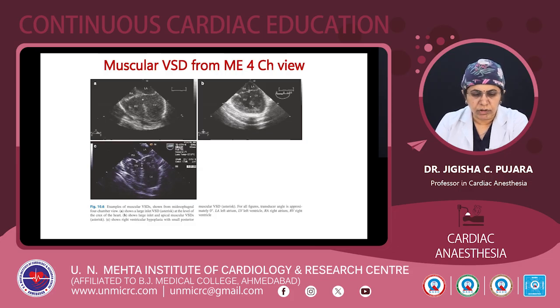And figure C shows right ventricular hypoplasia with a small posterior muscular VSD. Here again the asterisk shows it, and you can nicely appreciate the RV hypoplasia in this view.